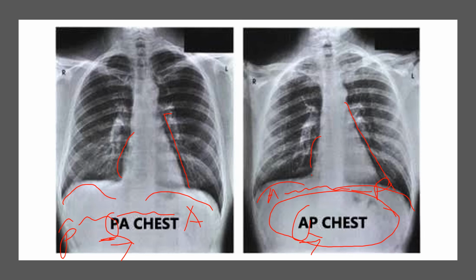So there are a couple things on here. If we're looking for diagnostic x-rays, if you can get a PA, it's going to be more diagnostically valuable than an AP x-ray. And so that's one of the things you'll be looking at here. Does it mean that an AP x-ray is useless? Absolutely not. This one's only taken from about 4 feet away, and this one's taken from about 6 feet away, around that area. So when you're looking at these things, you just need to be aware.